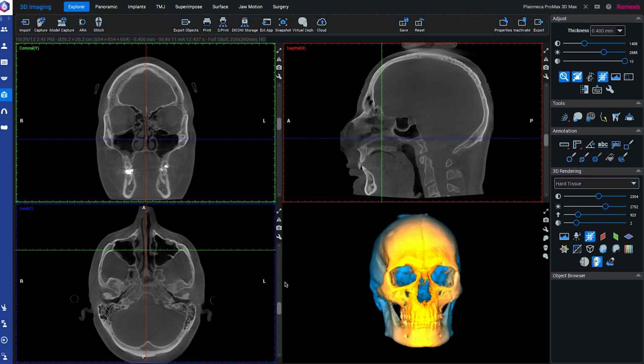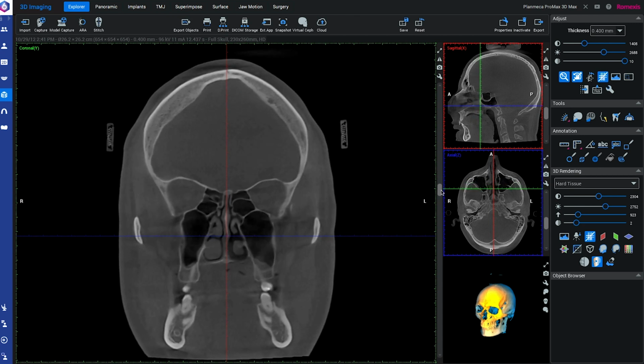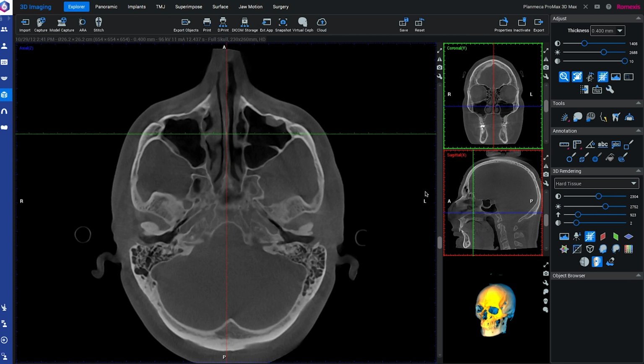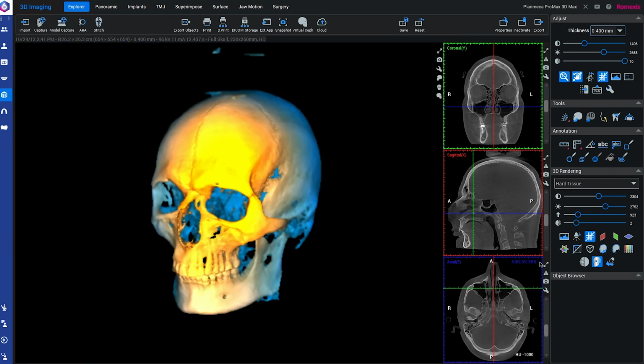Then this sub-module navigation is actually something that many customers have wanted to be changed. So now we have this sub-module navigation here above, so we can more easily navigate from one 3D sub-module to the other. And here we have this two-step maximization for 3D volumes. So when we maximize one of the views, we can still have the other views as reference so that we better understand where we are in the data.